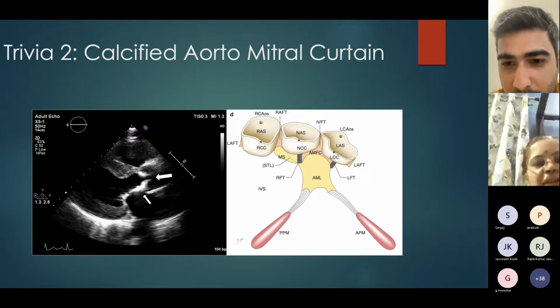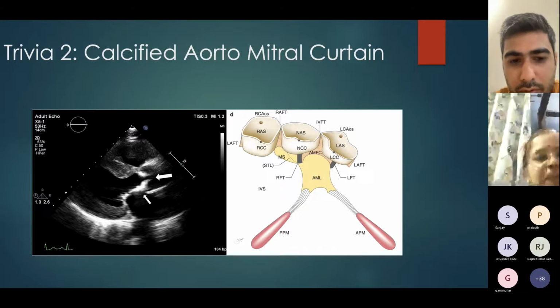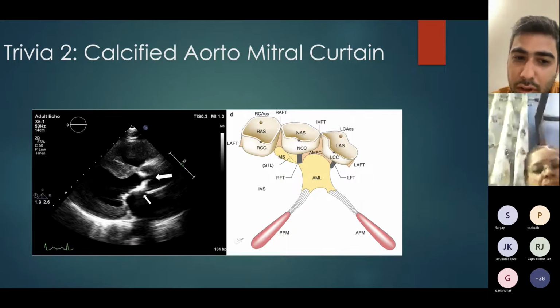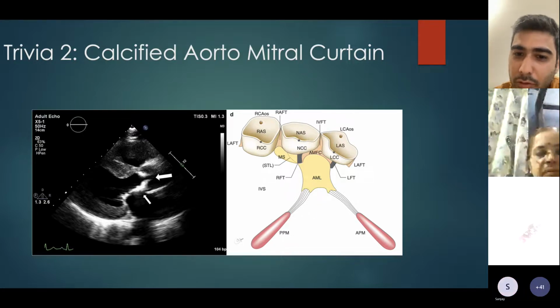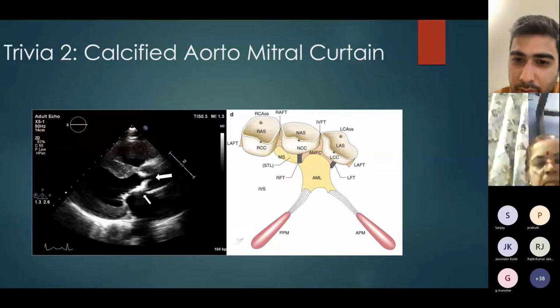Yeah, this is called teardrop calcification, is it? Right, ma'am. And how do we differentiate it from rheumatic calcification, for the benefit of students? The rheumatic calcifications would be present more towards the tips of the leaflets rather than towards the annulus, and would be associated with commissural fusion. The basic difference would be the pattern of the distribution of the calcium.